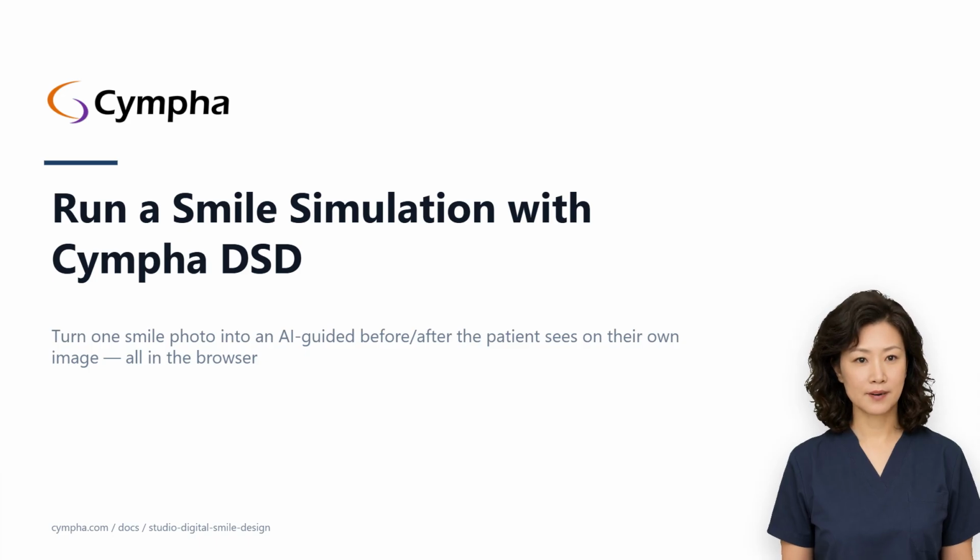By the end you'll know the 5-step wizard: photo, detect, frame, refine, generate, what each step is for, and the handful of habits that separate a convincing simulation from a clumsy one. Follow along with a photo of your own on screen, or listen now and read the written guide later.